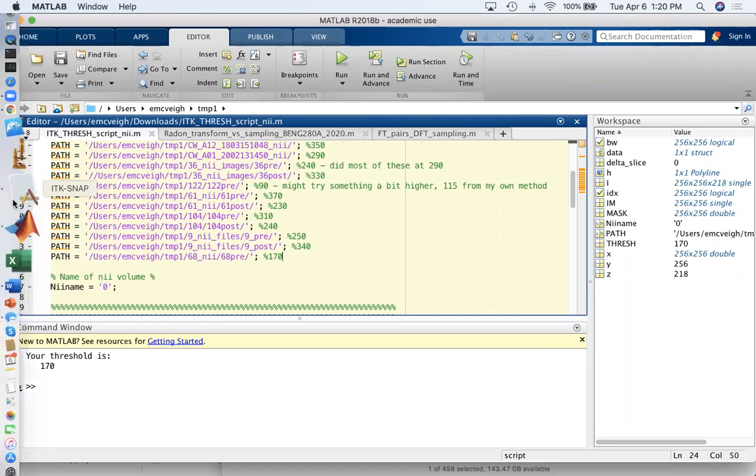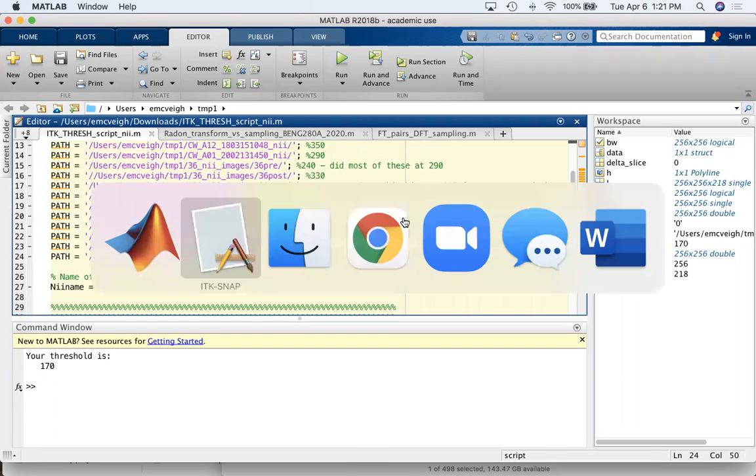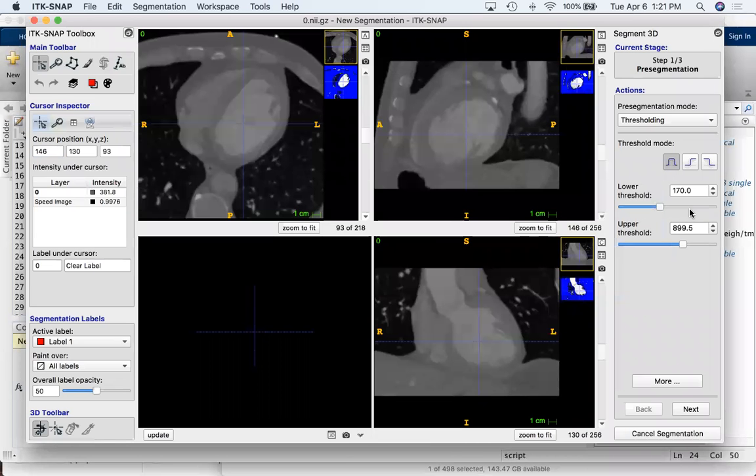Well, one way to do it is to go to Osirix, read in the DICOM image, and then do a histogram and take a look at the myocardium and the blood. That's another way of doing it. However, we always use this Otsu method in MATLAB so that we can say in the paper we used the same method.